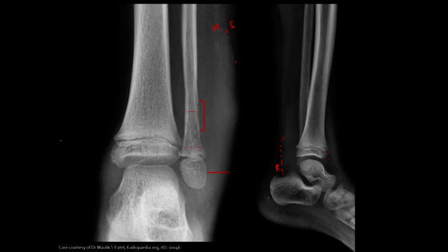There's open growth plates. So our top three differentials in this are osteomyelitis, osteosarcoma, and Ewing sarcoma. Because there's so much swelling in this and it's not really a soft tissue mass, I like infection as a cause much more than, say, the tumoral causes. Tumors tend to cause more mass, soft tissue mass.